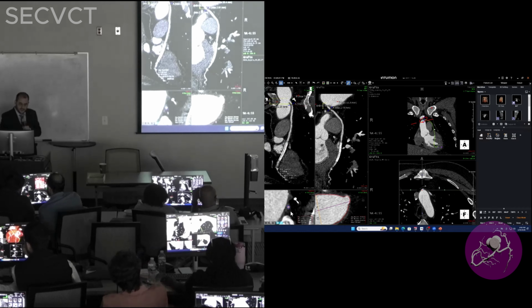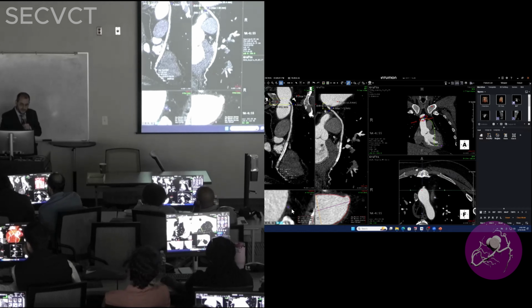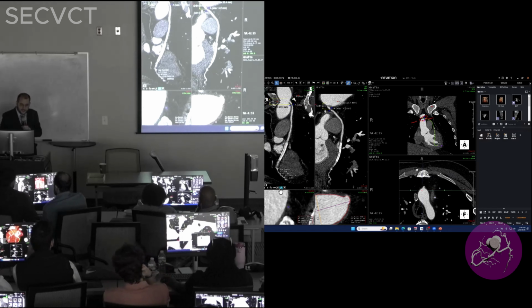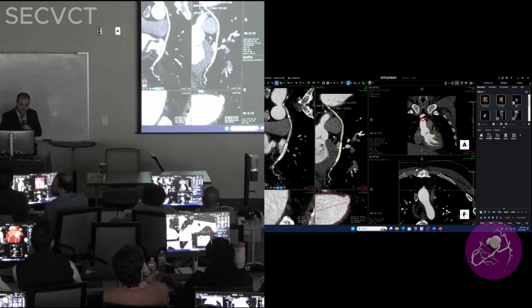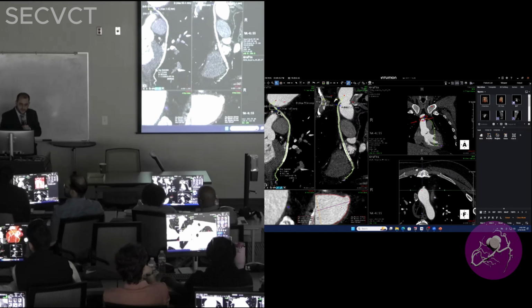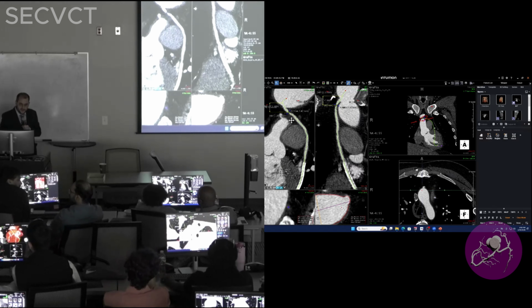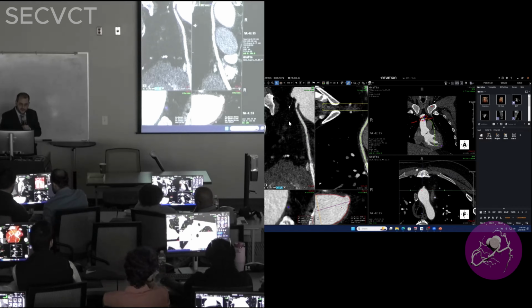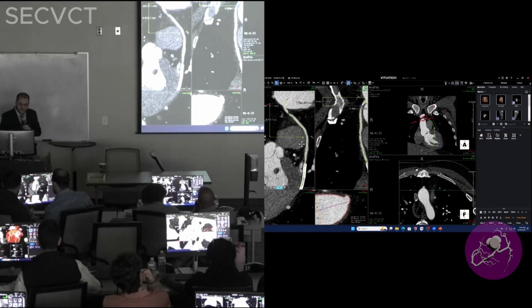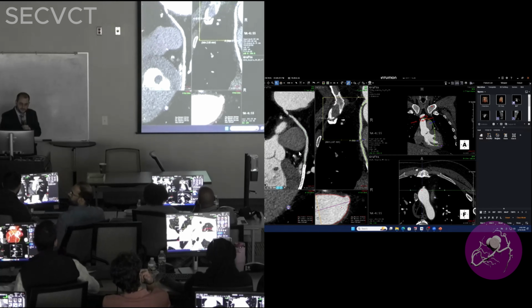Look at how the lumen gets narrowed and disappears briefly before it reappears. Okay. So that could be potentially a severe stenosis. Okay. Just make sure that your center line is where it should be, right at the middle, so it's not an artifact. Okay, so it looks real. All right. And moving down the venous, this is a venous graft.